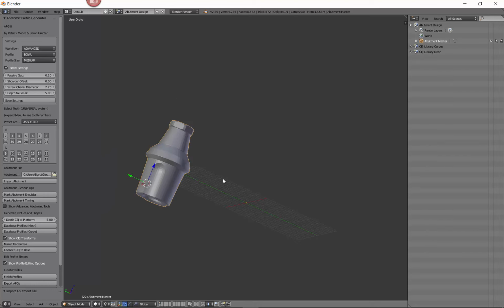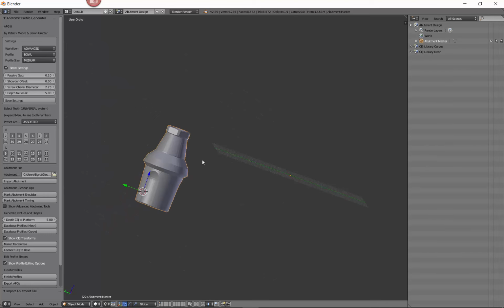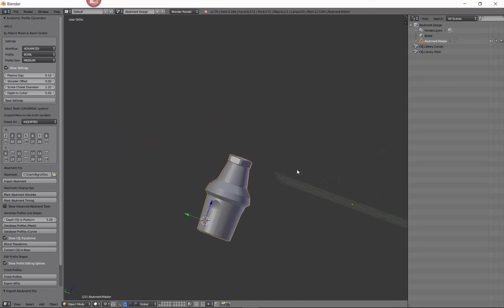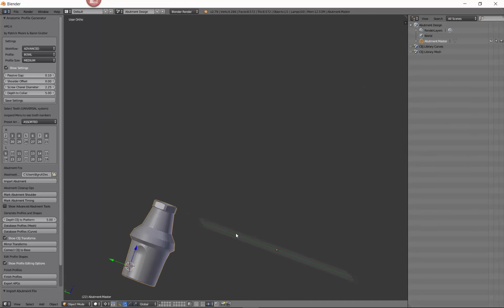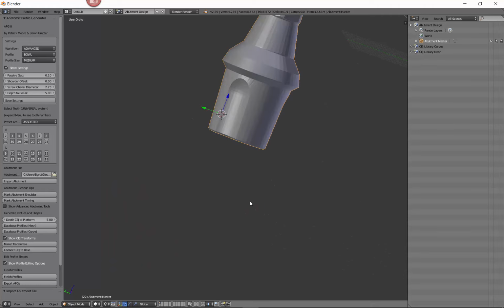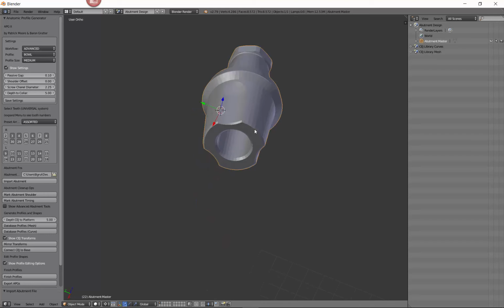If you have a wheel button on your mouse, pressing the wheel button, you can now move around and toggle around. If you hold the shift button on your keyboard and then press it, it allows you to sort of strafe in the gaming world or translate, move the whole environment around. Okay? So anyway, now that you know how to move around, I need to find something that's flat.